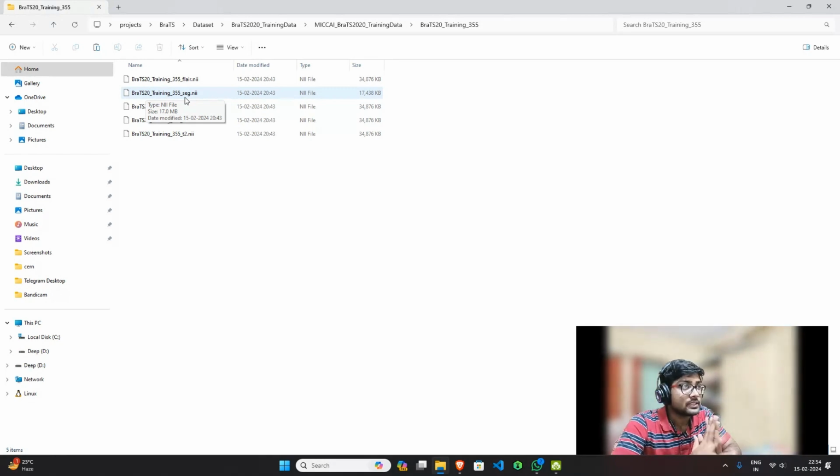So this is all about the dataset. Now we have to move forward to the coding part. This will be a quite long video, I'm not kidding, because it's a big project. Last time I didn't show you how to write the code, I just went on and explained it, but now I have time to make you understand how to write the code. So we will learn step by step. Remember something: while writing the code you might face errors, so we should not be demotivated by the errors.